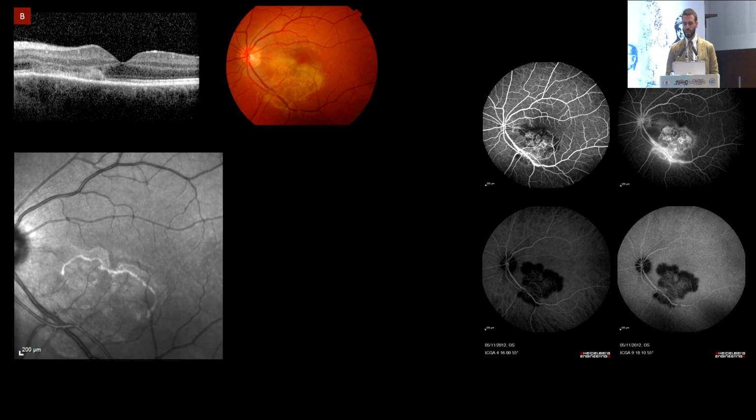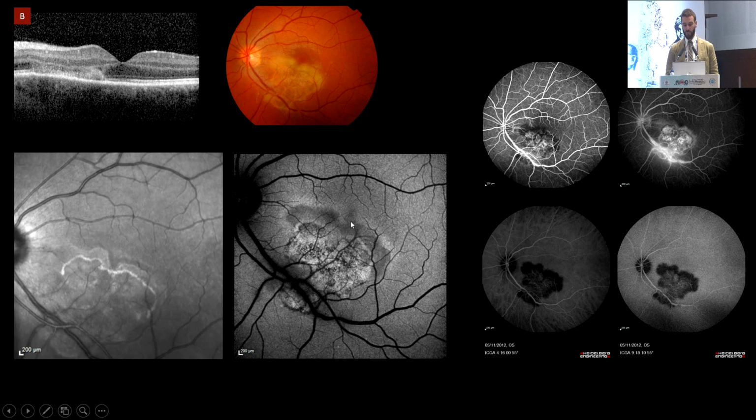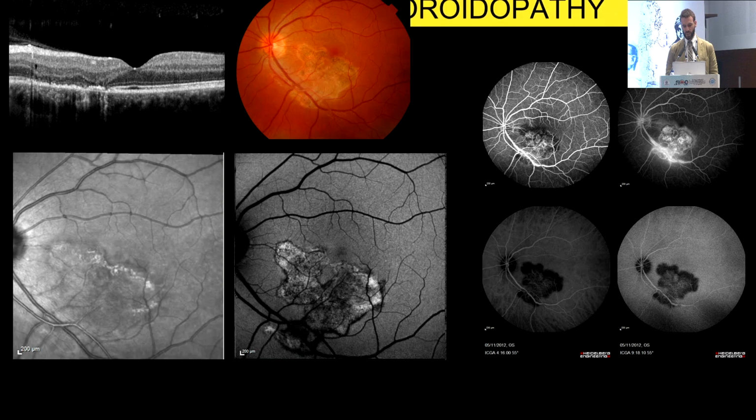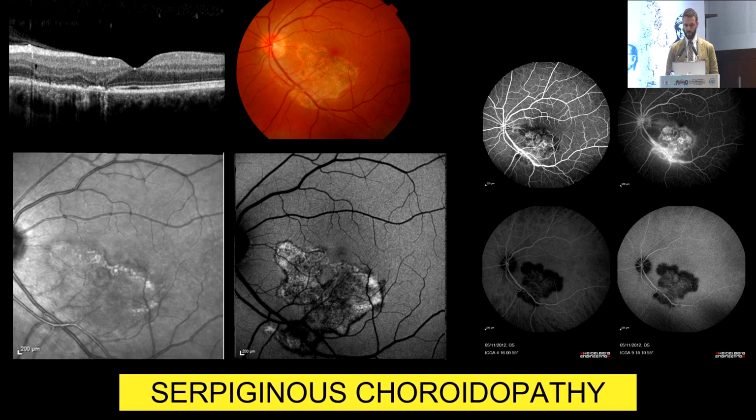ICG is showing the non-perfusion. FAF in this case is very useful to diagnose and follow up, as Dr. Vishali showed us, this case of serpiginous choroidopathy.